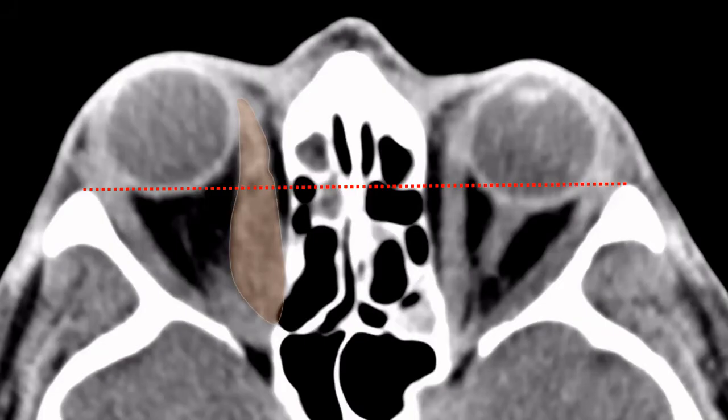Well, thyroid eye disease is bilateral in 90% of cases and symmetrical in 70%. That means it doesn't always have to be that way. So I always teach my residents there are always exceptions and you have to keep that in mind. So just because this isn't symmetrical, just because this is unilateral, doesn't mean it can't be thyroid eye disease.